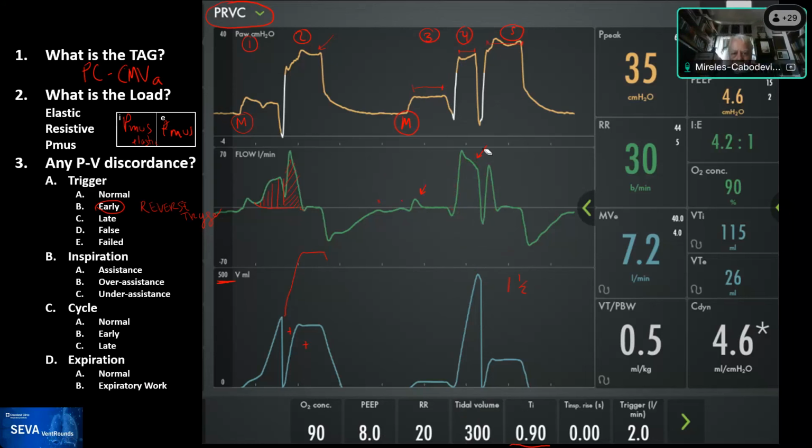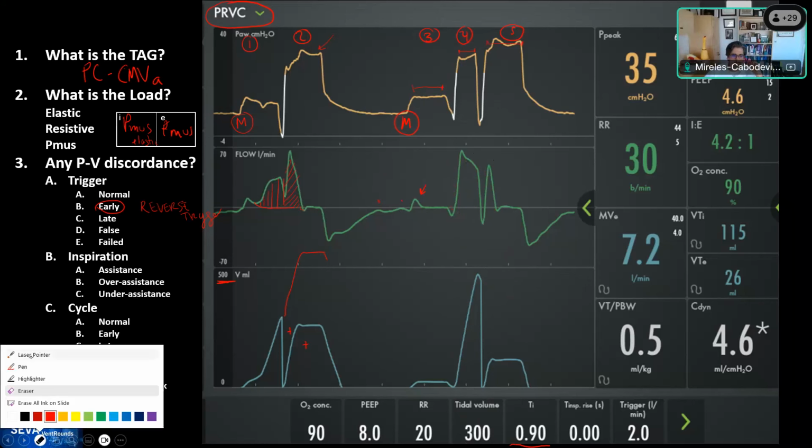The second part that I want you to pay attention to for a second is there is something that is highly abnormal on this waveform, because if you notice, we are supposed to be in adaptive pressure control, and that means that it reads the prior breath to give you exactly what you want.